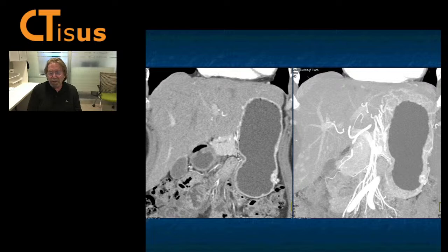Well, adenomas, polyps are typically not that vascular. Vascular things are neuroendocrine tumors, possibility, carcinoid tumors. Ectopic pancreas can occur, but it's more likely in the antrum and it's not that vascular. Metastasis, like from gastric cancer, are rare, but it can occur. AV malformations, but that doesn't look like an AV malformation. I don't see the feeding and draining vessels.